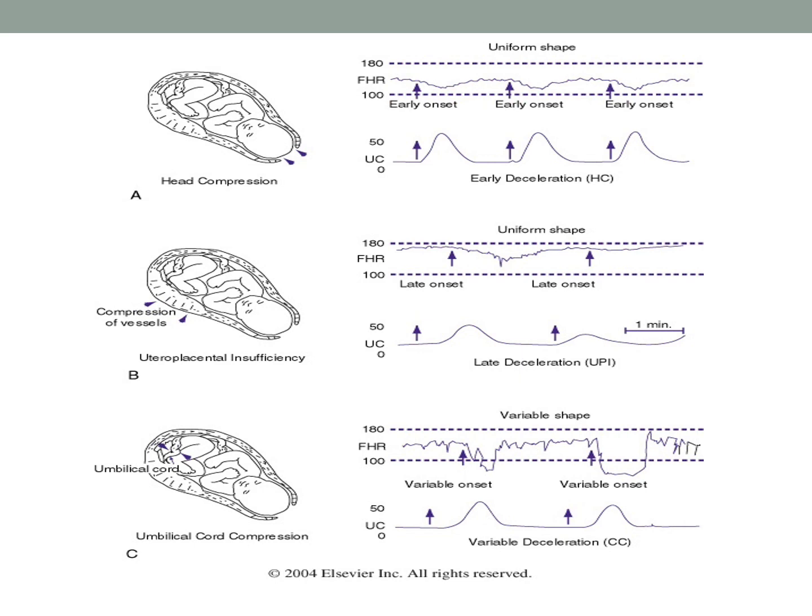This is a late deceleration. Again, contraction starts here, the deceleration starts here, etc. And then a variable, you have it where it's a quick drop from baseline. So it doesn't take a long time to reach the nadir. And it could be related or not related to the contraction.